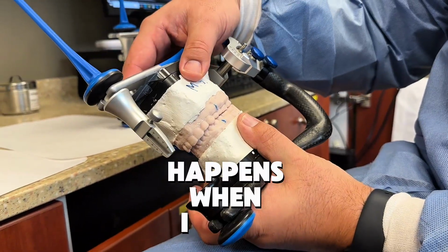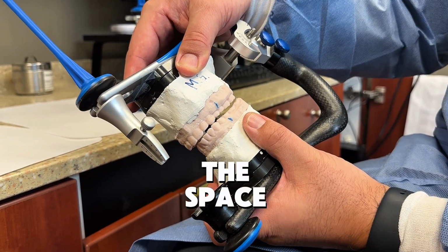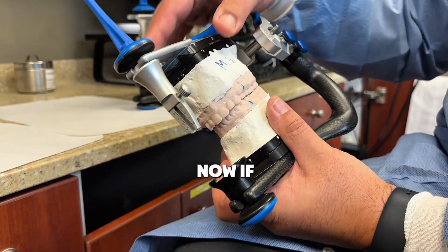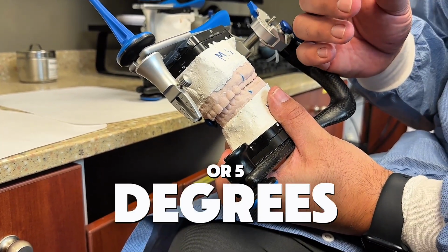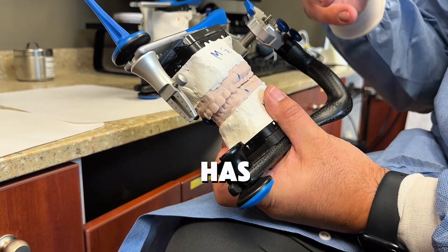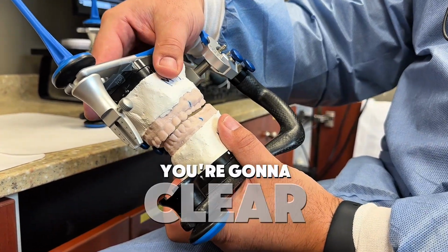Now watch what happens when I move. This space is now less. Smaller. This space is very, very small. Now, if you have your inclination set at 10 degrees or 5 degrees, and the patient has an inclination of 40 degrees, that's fine. Your cusps are going to be smaller. You're going to clear, right?